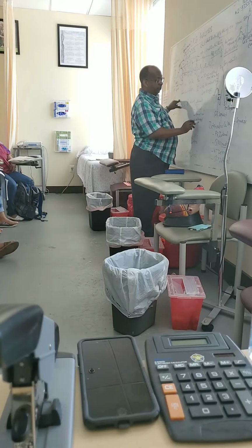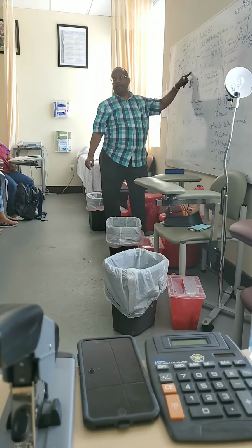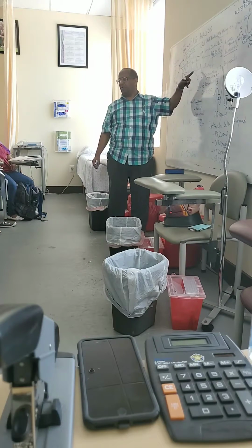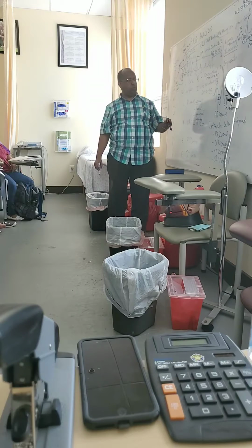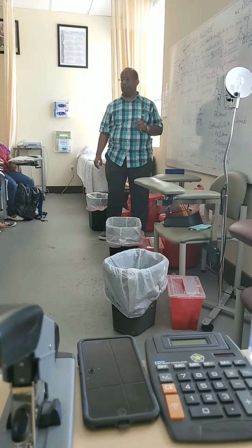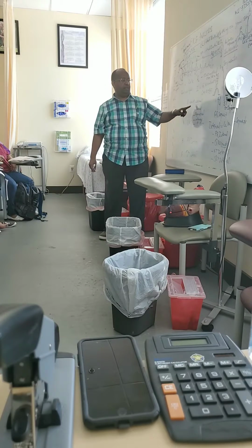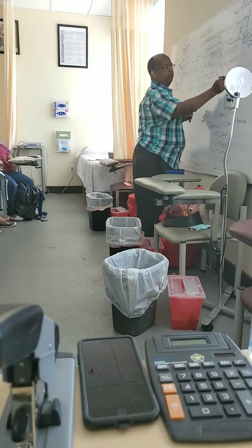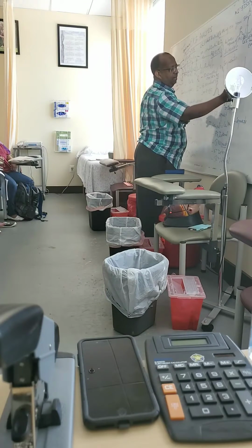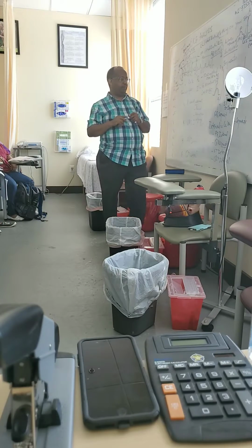And there should be one P wave for each QRS. That means wherever there is a P wave, there should be a QRS. If there is a missing P wave for each QRS, then it's abnormal. So these are the 4 parameters that you see for a normal P wave. Got it? Normal P wave means what? It should be upward, round, symmetrical, with this side and this side the same. And there should be one P wave for each QRS. They are coupled.